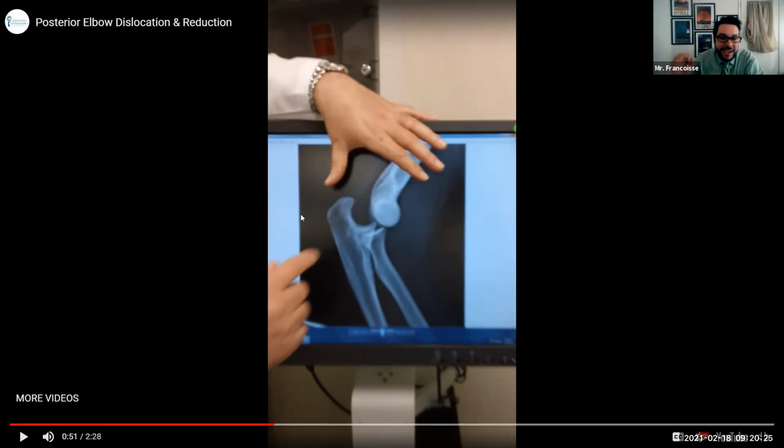And this is one of the problems with dislocations: this will not heal itself, right? Your arm may pop back in, well, it could, right? If you had, say, a cut across this bone, it could heal itself because it's in the right spot. But this is the main issue. You have tendons, you have skin, you have muscle, you have a lot of other things that are being stretched and pulled and ripped when this is in the wrong spot.